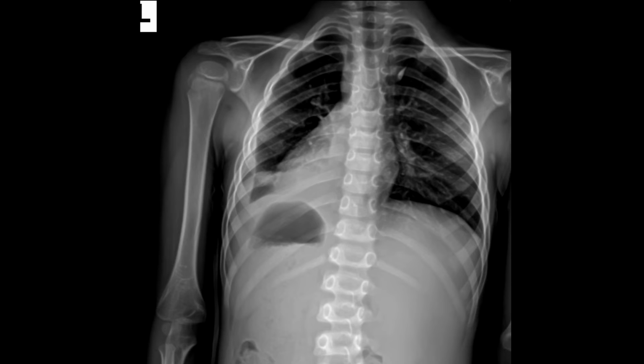Now, most radiologists' pet peeves are rib injuries, and it's a very tough ask when you are only provided one view. So anytime you're concerned about a rib injury, multiple views are essential. Rib pathology can easily hide on a single view. So again, multiple images of the area of concern are very important in ruling out pathology. So hopefully that bought you a little bit of time to look at this image, and I'll zoom into the area of primary concern.